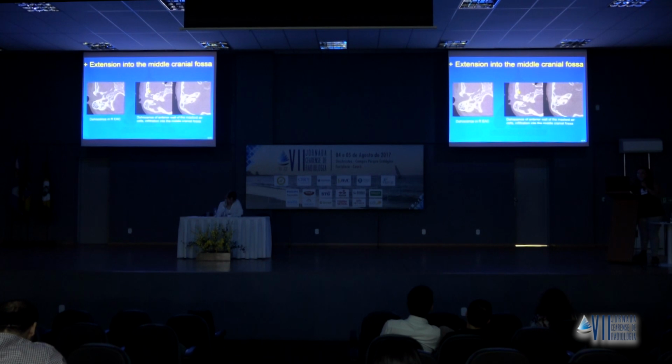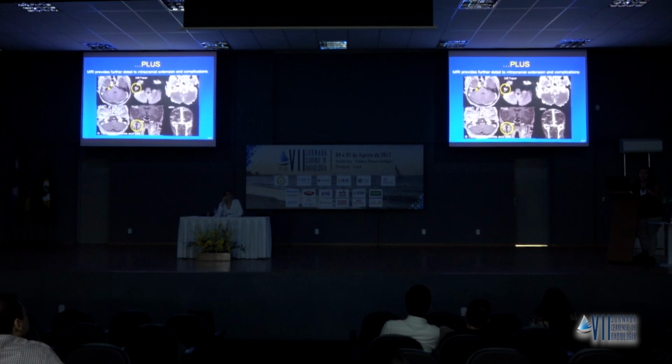At this point, the concern for intracranial complications was clear and the right jaw pain was quite concerning. So what do we do next? MR imaging with contrast would be our choice. On the MR, the extension into the middle cranial fossa, we saw by dural thickening and enhancement.